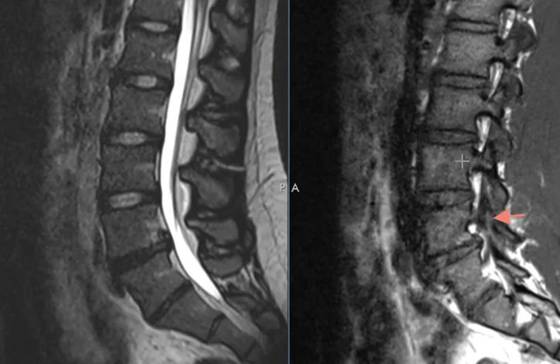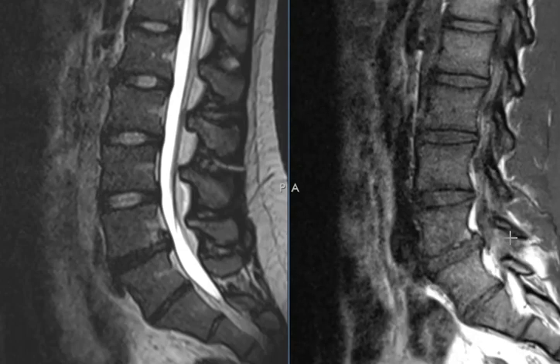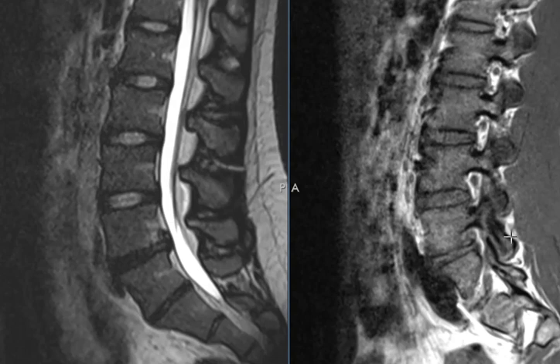And this one we can see this continuity of bone, the pedicle here going down to the superior articulating facet. And there's no fracture there, but right here the pedicle comes over, vertical fracture line, and here's that articulating facet there. So bilateral L4 pars fractures. There's that vertical fracture line, and the bone is discontinuous right here.